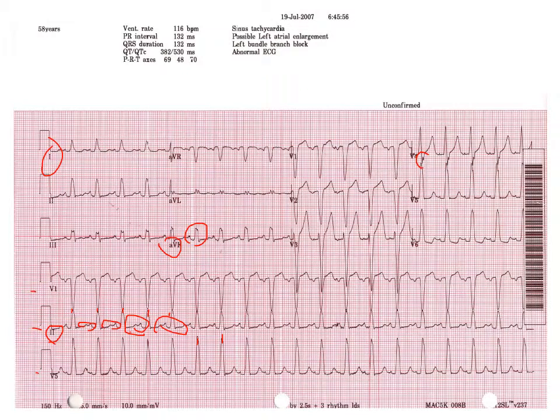Well, if you look over at 4, 5, and 6, you actually have bunny ears, and you can especially see that in a downward slope in V4. You've got an upside down bunny hanging there with his bunny ears down. And then in V5, you've got upright bunny ears, or R prime. That's why you've got a widened QRS, because you've got a bundle branch block. Electrical activity is taking time to go through and widens that QRS out. So this has bunny ears in V4, 5, and 6. What is that? Left bundle branch block, right?